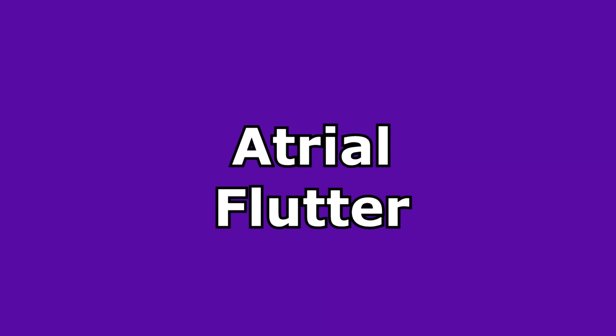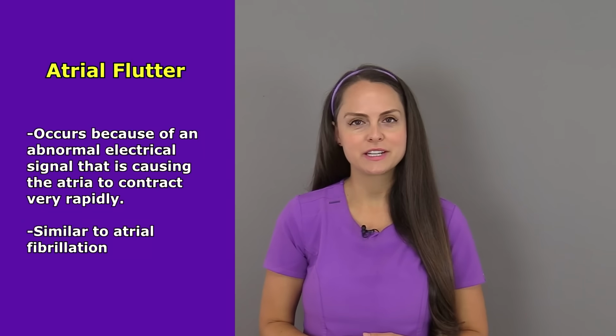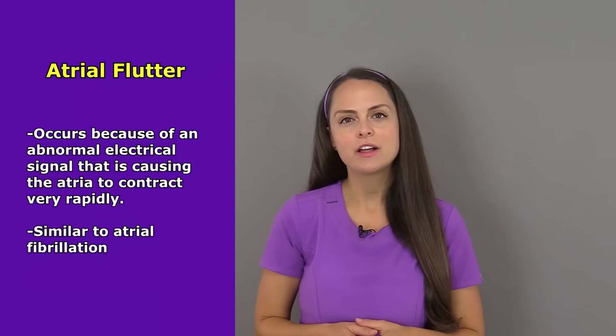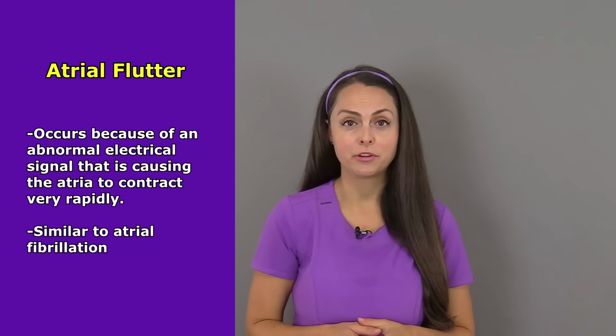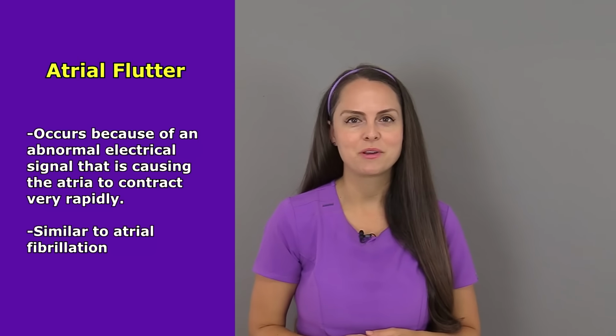Another rhythm is atrial flutter. Atrial flutter, also referred to as a flutter, occurs because there is an abnormal electrical signal causing the atria to contract very rapidly. Now, atrial flutter is similar to atrial fibrillation that we talked about in the previous review, but there are some differences that you want to be familiar with.